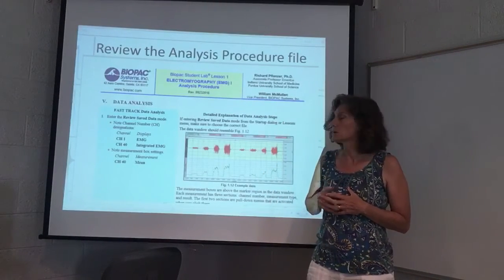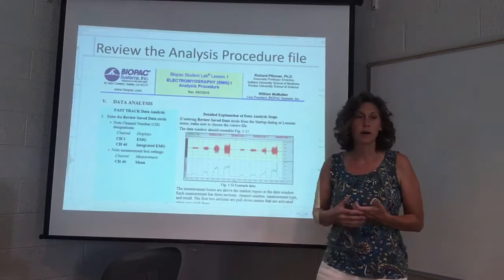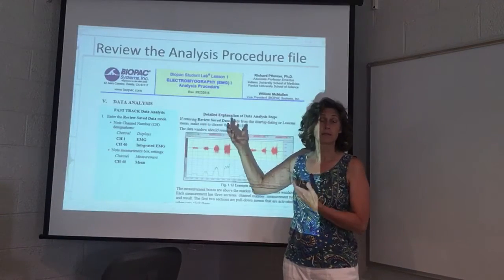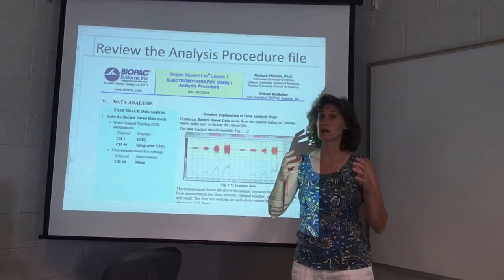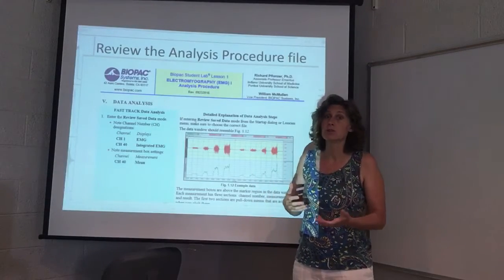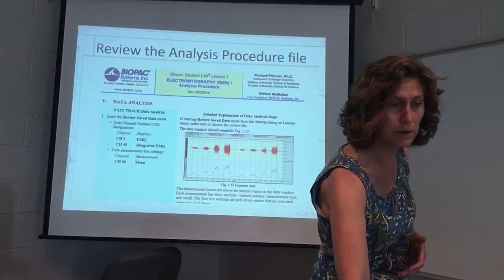So typically, this first part isn't essential. What it is telling you is you need to go into the review save data mode. So that's going to be your time to go into this. The software is going to be saying, okay, do you want to run more on your procedure, or are you ready to enter review save data mode? So you'll be doing the reviewing data.